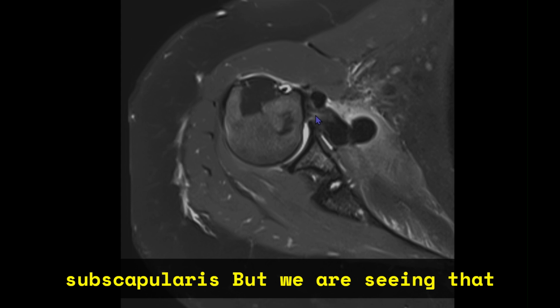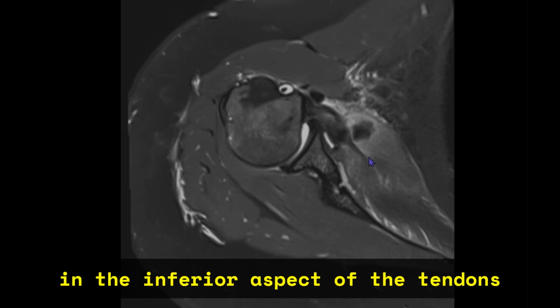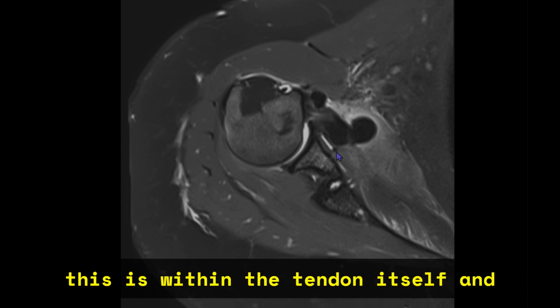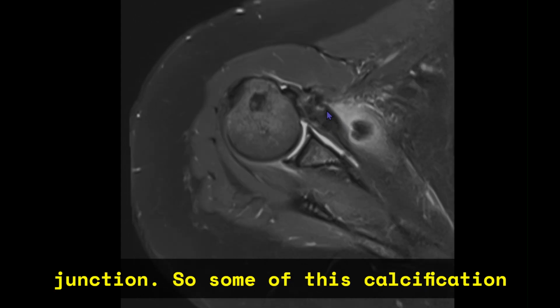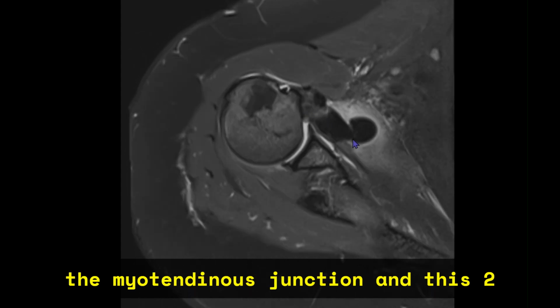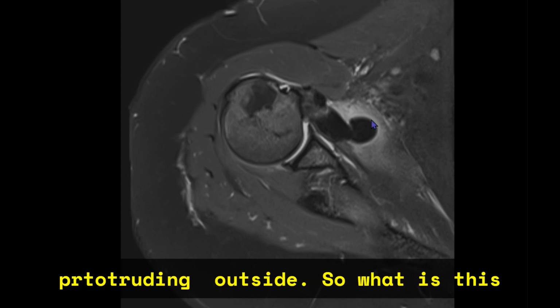But we are seeing that in the inferior aspect of the tendon there is this chunky calcification, and this is within the tendon itself and extending medially up to the myotendinous junction. So some of this calcification is within the tendon, some is within the myotendinous junction, and these two large chunky calcifications are seen protruding outside.